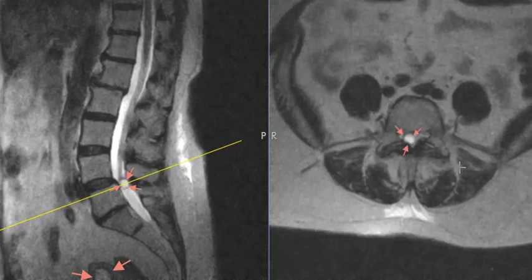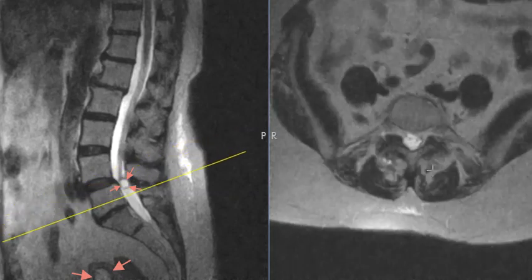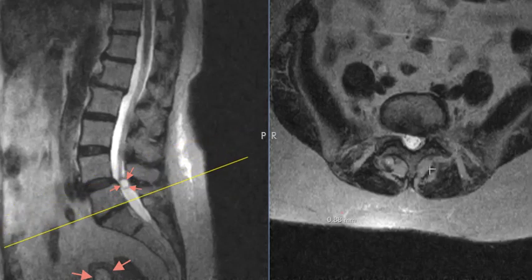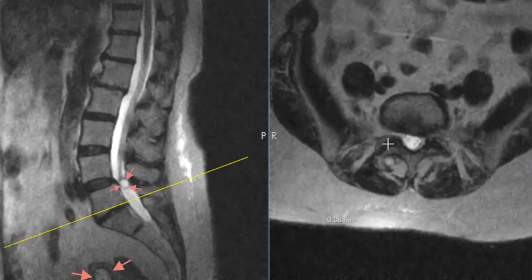So these facet cysts are pretty common. Sometimes they poke off the back of the facet joint, and sometimes they come off the front. She has a little synovial cyst back here, very hard to see behind this facet on the right. Here's the left facet joint. The facets are in the back. There's one on the left and right, and they lock the vertebral segments together.